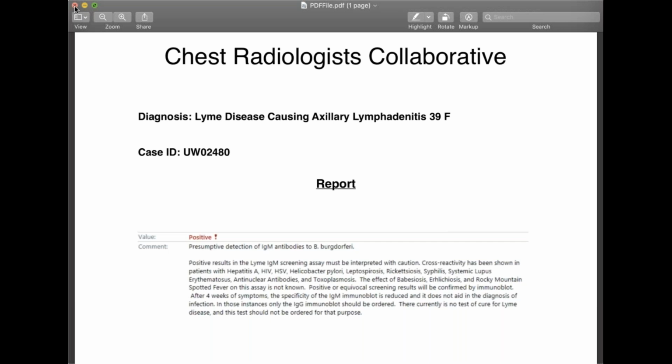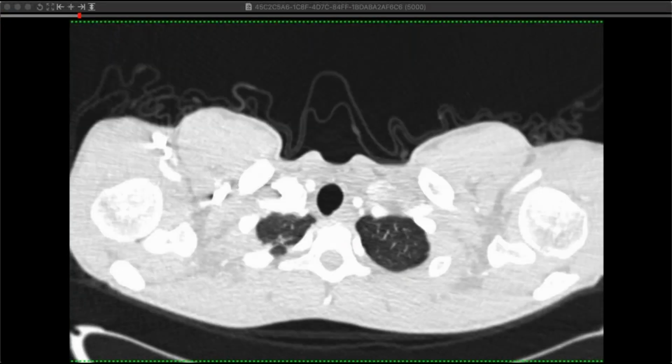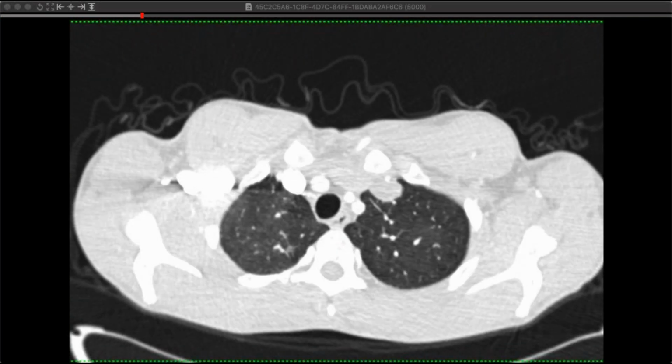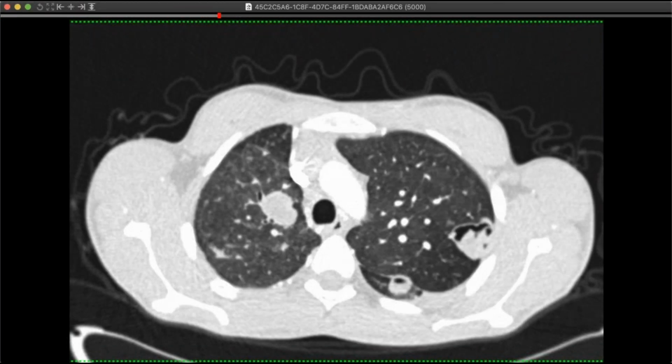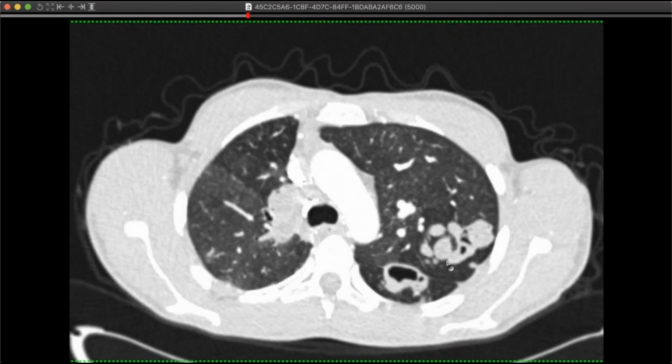Okay, well, that's my first case of this. All right, this was a case that was sent to me by a radiologist in Kashmir, in the Indian portion of, well, in the state of Kashmir in India. This is a young patient. I don't know exactly how old, but looks pretty young, and presented with cough, and you can see has these sort of cavitary lesions. I'll show you on soft tissue as well.